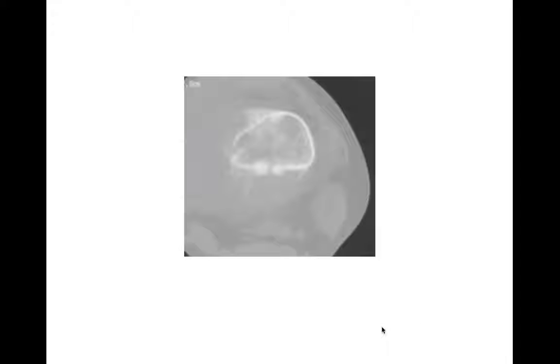This is an axial CT scan through an osteosarcoma, showing us a Codman's triangle periosteal reaction right here. Here's the periosteum lifted up off the bone. It's kind of filling in with some sclerosis here, and you get a sense there's probably some hair on end periosteal reaction here. Again, not so important that you describe it perfectly as the type of periosteal reaction, as long as you recognize that this is an aggressive periosteal reaction. So you can think of aggressive tumors or aggressive lesions causing this. In this case, again, osteosarcoma.